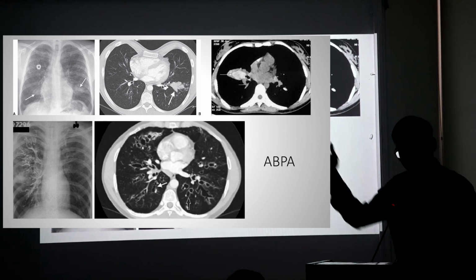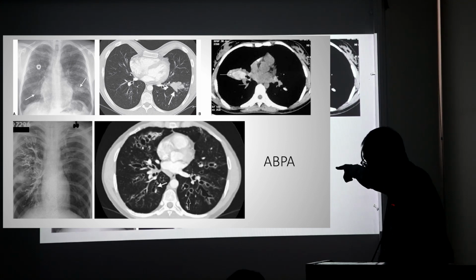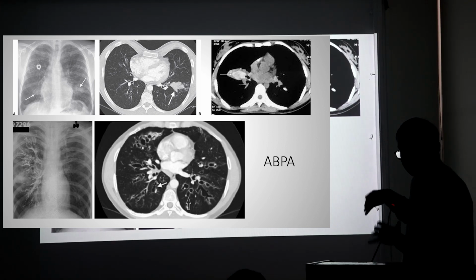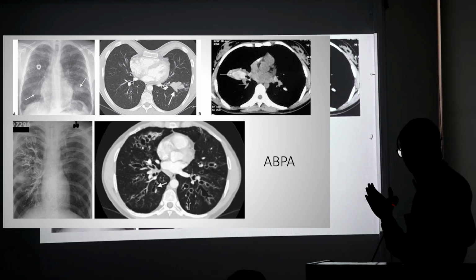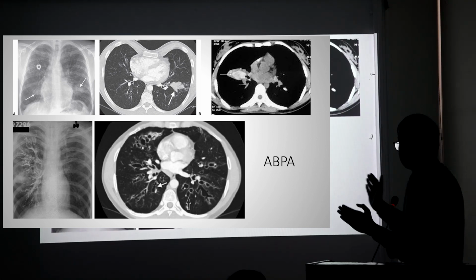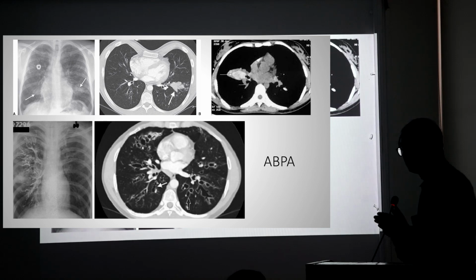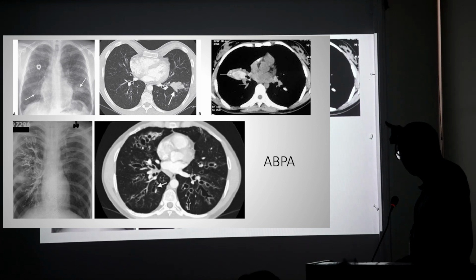What can we see? This is related to the previous slide only. In this CT, we can see there are a lot of grape-like clusters, rounded opacities. What is that? Bronchiectasis. Is it in the central portion of the lung or the periphery? Central bronchiectasis. Okay.